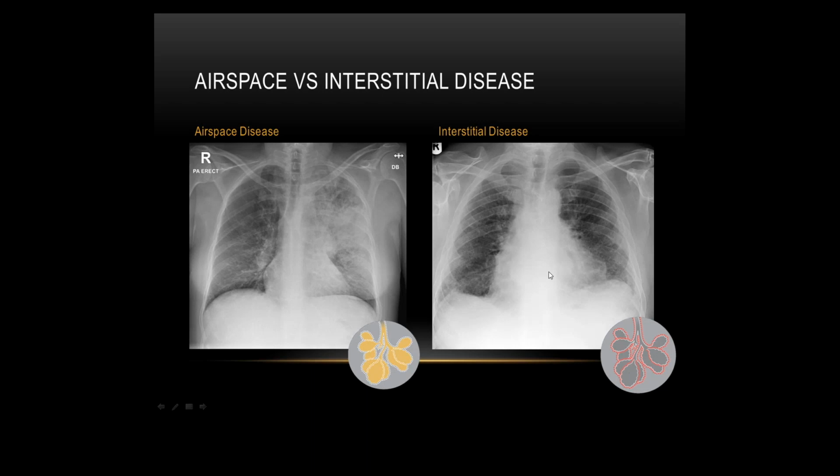Because what you've got to remember on a chest X-ray is that to actually see a pleural effusion, you need about 270 mls of fluid. Imagine that's a mugful of fluid before you see any sort of blunting. So in cardiac failure, you could have quite a lot of fluid on one side and only a very little bit on the other, so it might give the impression that you've got a unilateral effusion, but they might have bilateral effusions, you just can't see it.